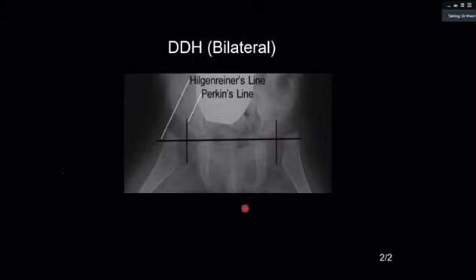Now, if you see here, the femoral capital epiphysis, which is barely seen here, is a very important epiphysis for you. There are many films in which this will tell you the age of the patient.